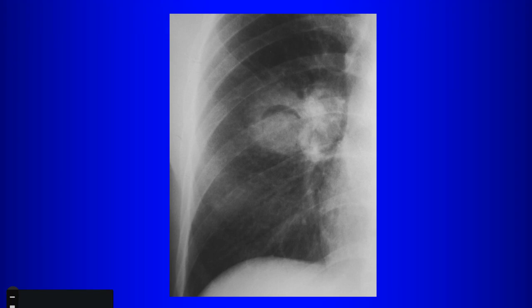Is this an Aspergilloma with a halo sign? Well, let's go back to what is the sign on the radiograph itself. What do you call this sign? This is, yeah, so it's air crescent sign, right? When you have this peripheral crescent of air, right?